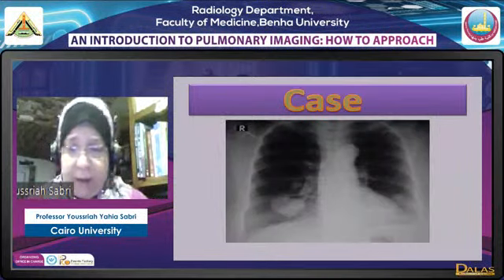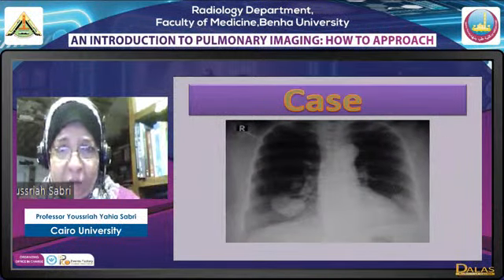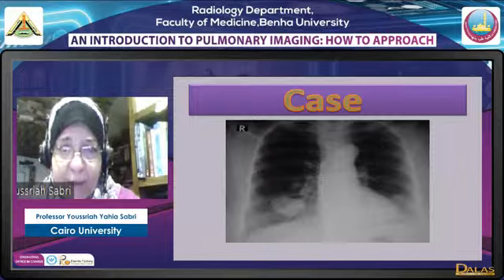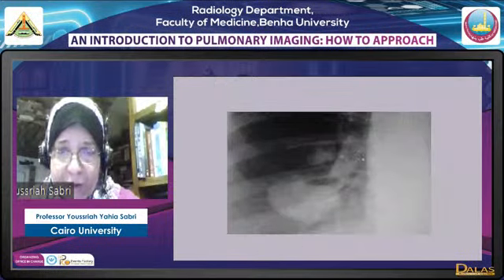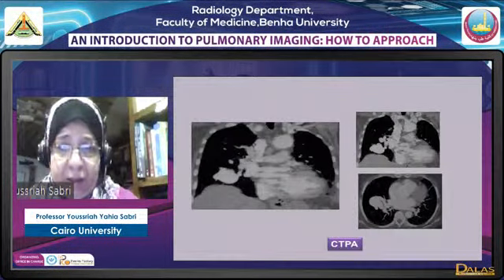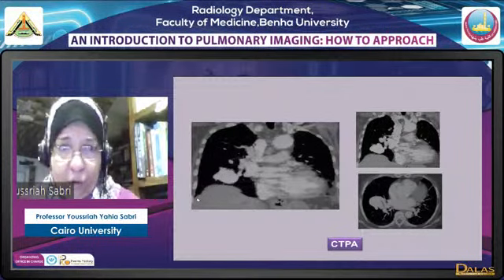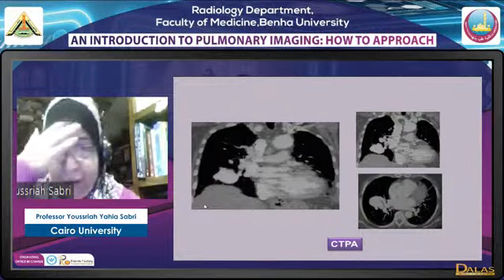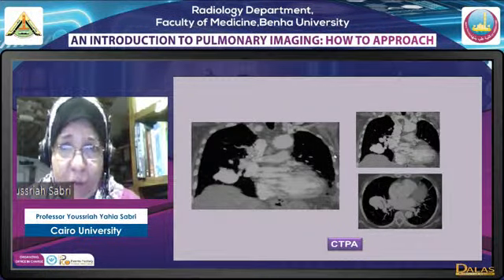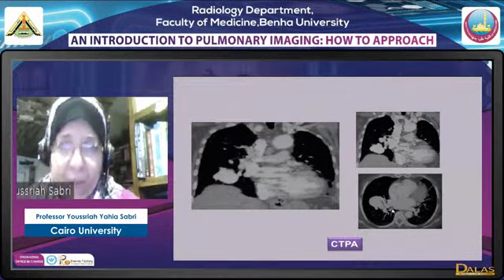There is another case here as well. This was an elderly female coming with hemoptysis, chest X-ray showing a lobulated large mass with prominent interlobar artery related to it, and another lesion. Again, AVM considered. CT was done, and the CT pulmonary angio is relatively old, more than 15 years old. Okay, the appearance is of an AVM with multiple lesions, supply from the interlobar artery, and drainage into the inferior pulmonary vein.